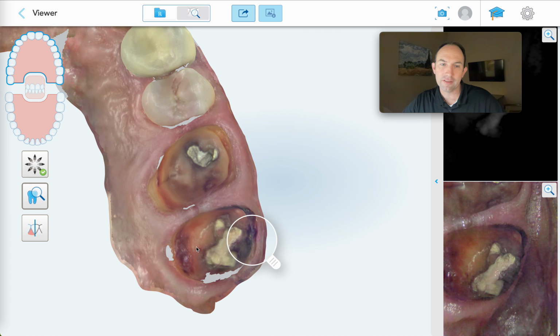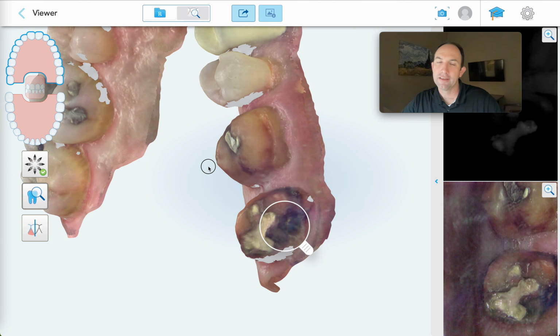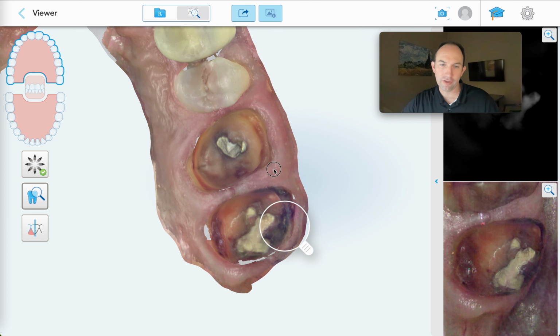A lot of times in this scenario, we have to actually tiptoe and be very careful with our words from the standpoint of telling a patient, for instance, it looks like the tooth is probably fixable, but in other situations that I've encountered or other patients of mine have found that a tooth like this that's been missing a crown for some period of time may not be fixable even though it appears like it is. And the reason for that is the saliva tends to soften the tooth structure over time, and we may get to a point where there's just not enough healthy tooth left to save.